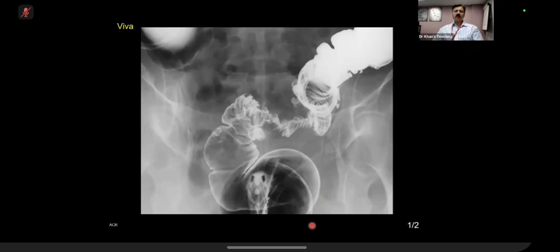Now, you're using two different terms here. Now, I'll take over. You should have a very clear-cut idea about what happens in diverticular disease. This word should be in your vocabulary: diverticular disease, then diverticular stricture, then diverticulitis, or you can say complicated diverticulitis when you see fistulae here.